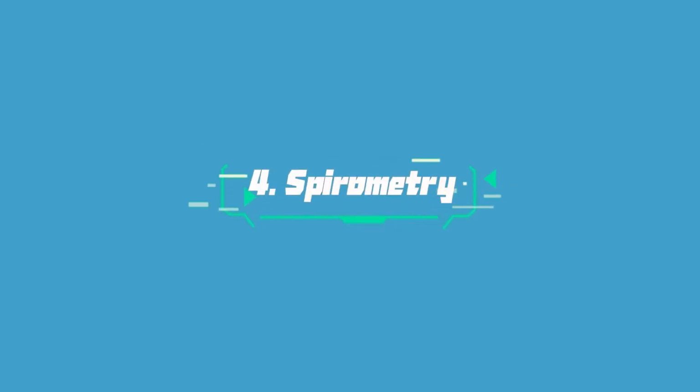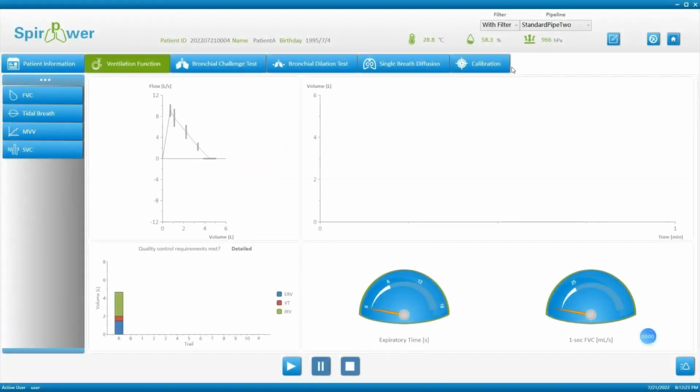Spirometry. Forced spirometry. Entering forced spirometry screen.